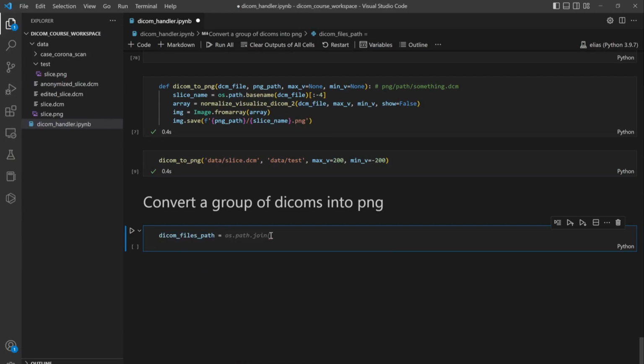The first, the library that we'll use is called glob. It has a function called glob. So this function glob will help you, if you give it a path, it will return, for example, if you have 3 elements, a list containing the paths for all the elements that are inside this glob function, okay?